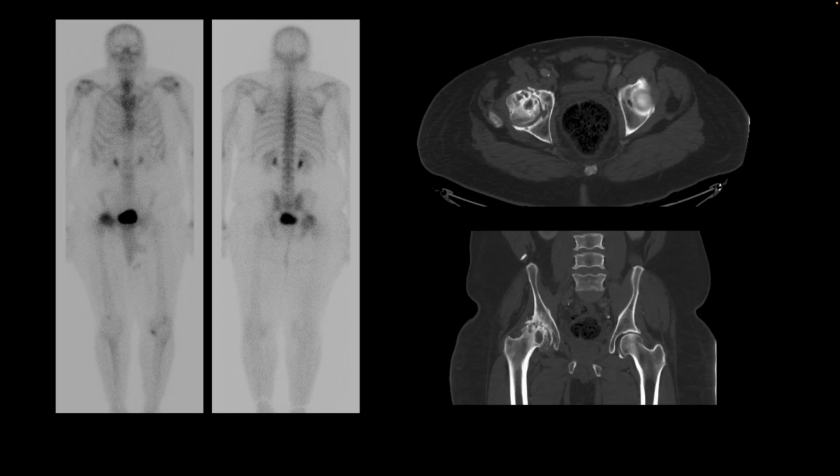Here is our next patient. They underwent a whole body bone scan. So we have acquired anterior and posterior whole body images to look for osteoblastic bone metastases. The only finding we see here is this diffuse increased uptake in the right proximal femur or femur head, and correlating it with the CT, we find that there are extensive degenerative changes. There is asymmetric joint space narrowing, there is subchondral sclerosis, and cystic changes consistent with severe DJD. So remember that degenerative changes can lead to increased uptake on a bone scan and not call this osteoblastic bone metastasis.